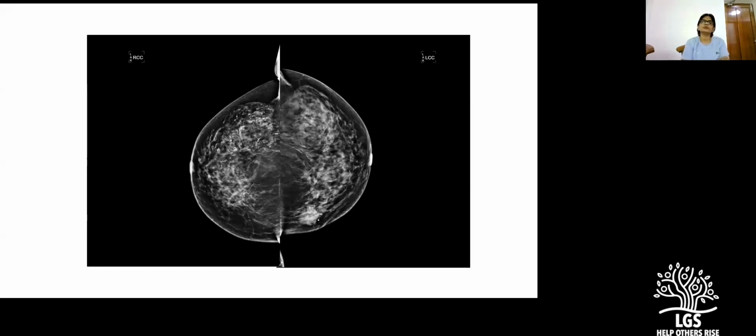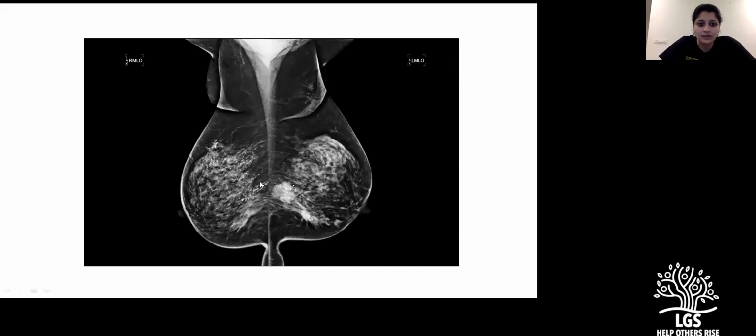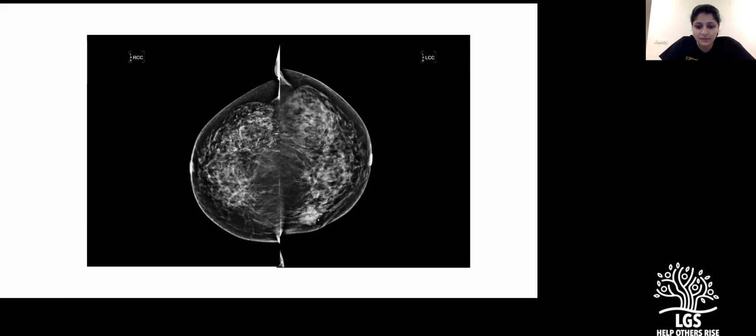So, Keith, did you want to look at this mammogram? Yeah, so to start off, I think this is a dense mammogram because you can see there's a lot of glandular tissue heterogeneity seen on both sides. On the right side, so if we look at the right side first, as you mentioned, the marking is closer to the outer aspect. And in the outer aspect, there's a lot of calcifications that you can see in this outer quadrant of the breast. Also on the left, as ma'am mentioned, you should not forget findings seen on the contralateral mammogram.